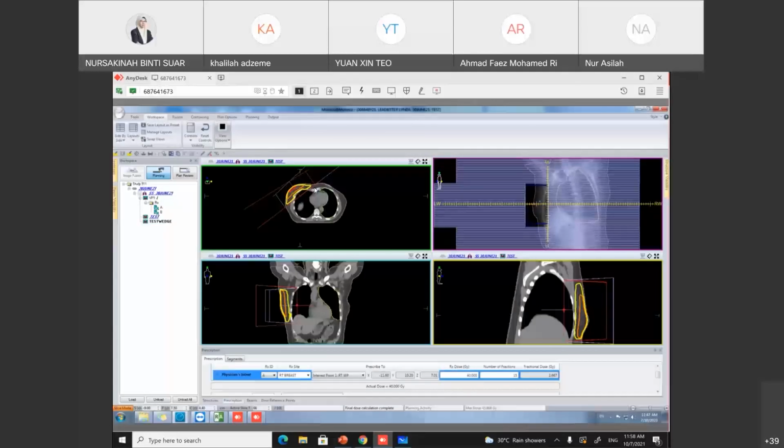Yes, you can use the wedge because of the contour here. You need to add a wedge here like this. The thick end will be facing outward to make it back to the square, like this.